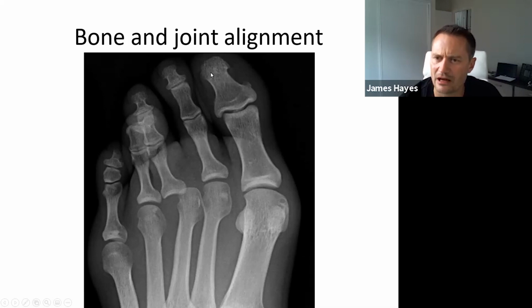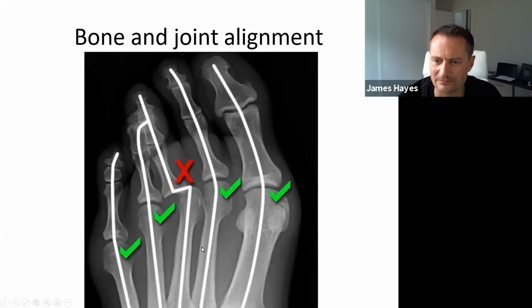And then another, and you say, well, that seems to be all right, but they've come in with an awful lot of pain. So you can ignore either side a little bit. You find out where the source of the pain is, and you find out that it's in the midfoot. So then you start to look along these joint spaces here, and you say, well, it all seems fine. But there's a bit of a problem here because that little sort of hat doesn't fit on this head.